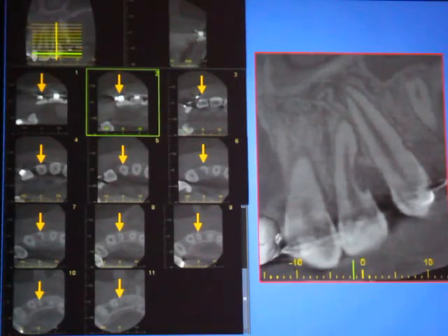So that is not only one view that we get. If I have to give you an example, that's the lateral incisor, and we can see this tooth from axial view at different levels, starting from the crown to the root of the tooth. As you see that there is an orthodontic bracket on it, and as you see that tooth in the sequence, you can see the defect appearing here, and you can see what is the shape, what is the location of the defect, and then once again at the root portion it is a complete circle here indicating no defect.